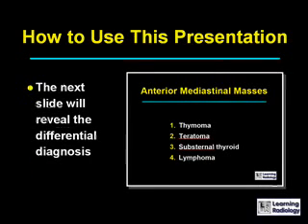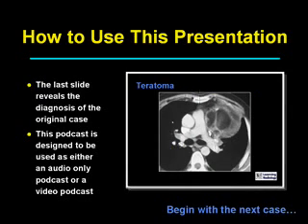The next image will reveal the differential diagnosis itself, and the last image for each set of differential diagnoses reveals the diagnosis of the original case. This podcast is designed to be used as either an audio-only or a video-only podcast, or both. So let's start with the next case.